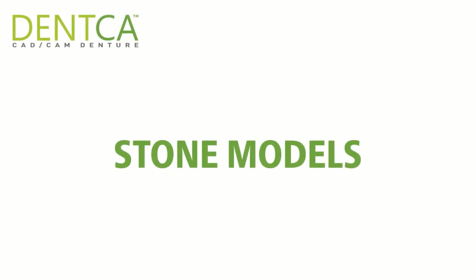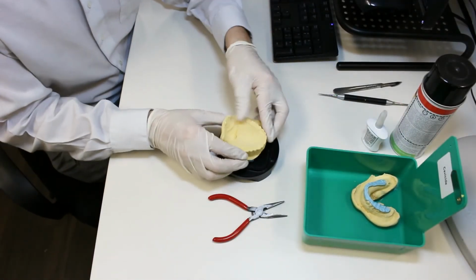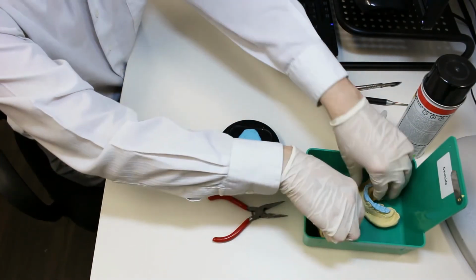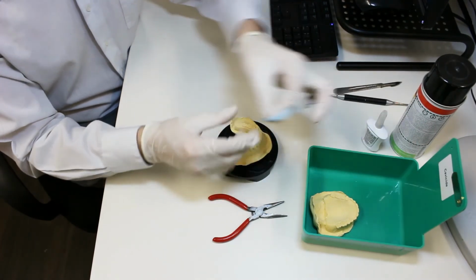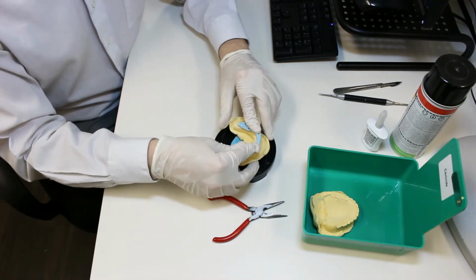For stone model cases, place the upper stone model with the teeth facing up at 0 degrees. Repeat the same with the lower scan with the teeth facing up at 0 degrees again. And for the bite, use either of the models and attach the bite registration material to it for scanning.